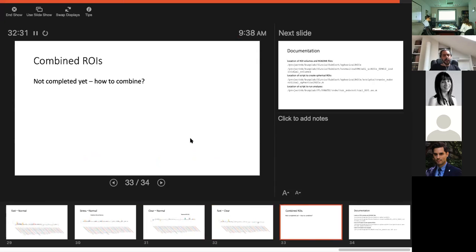Also, with respect to the many different comparisons across the conditions, perhaps we should do something a bit more structured, which would be running a simple F-test across whether there is any difference between the four conditions, and then for the results where we find significance, we look at which conditions are causing that difference, rather than performing a full set of analyses on the individual pairs of contrasts, which would need an additional correction for multiple comparisons.